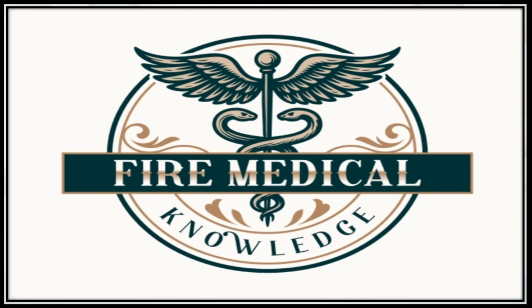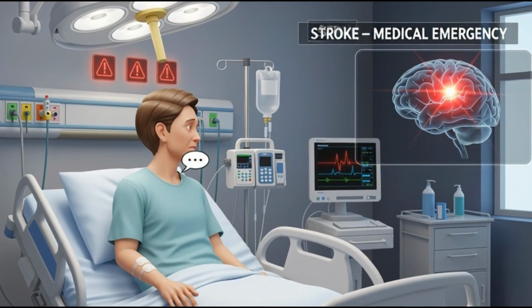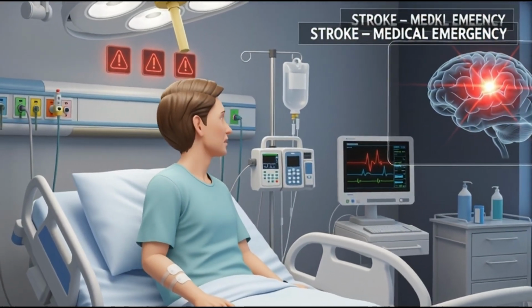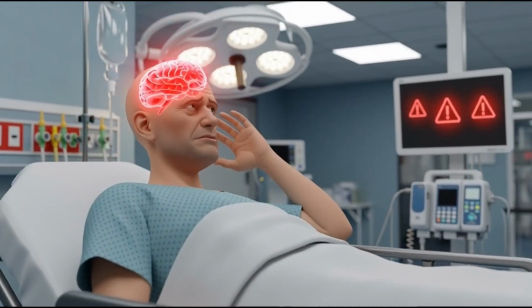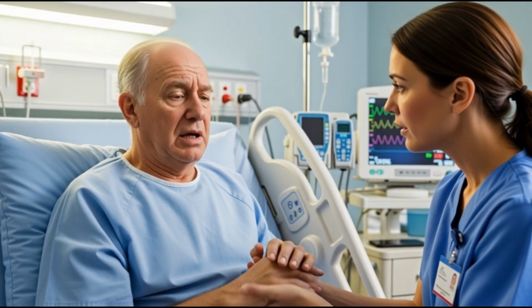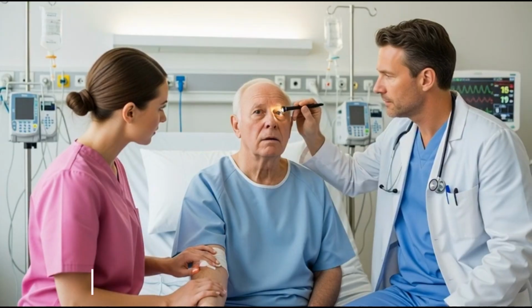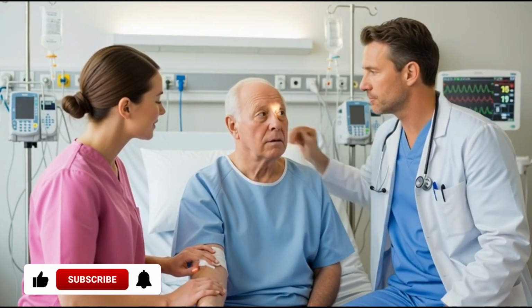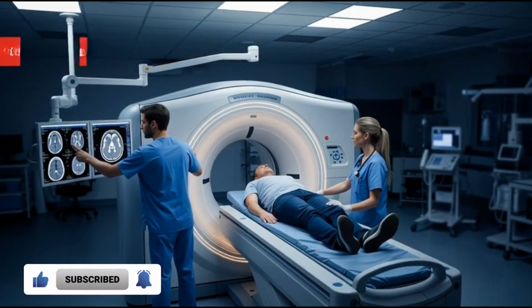In today's video, we are going to discuss CT brain stroke identification. Stroke is a medical emergency that requires rapid diagnosis and immediate management. Every minute of delay results in the loss of millions of neurons. When a patient presents with sudden weakness, facial drooping, speech difficulty, or altered consciousness, the first and most important investigation is a CT scan of the brain.